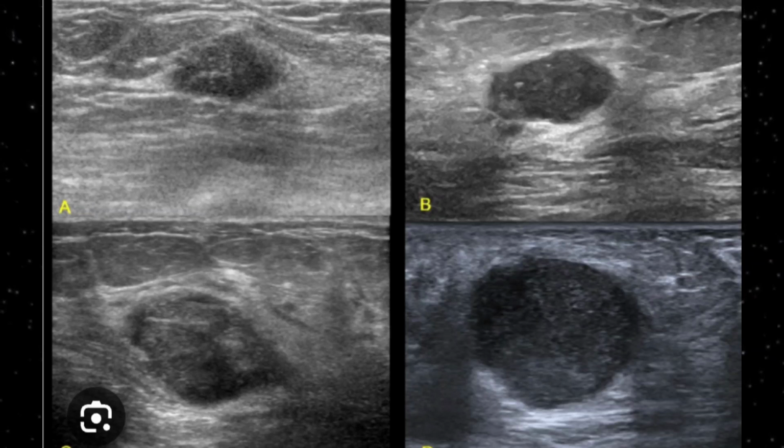If you come down towards the left side, still I would say this is an echogenic lesion, and it favors mostly a benign lesion. But if you look at the right-sided lower image, this is a markedly, predominantly hypoechoic lesion, which makes it suitable for a malignant lesion.